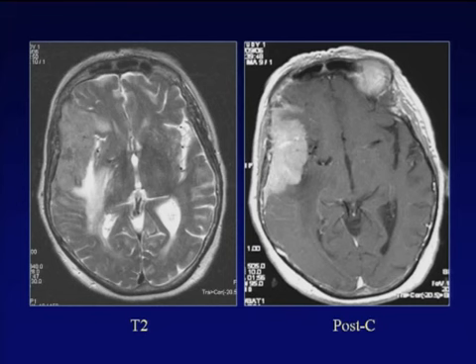The characteristic in meningiomas is not the enhancement. Sometimes other tumors also have homogeneous, very intense enhancement. But few tumors in the brain have low intensity on T2 weighted images. That means very cellular, very dense tumors. So you see low on T2, intense homogeneous enhancement in this case of meningioma.